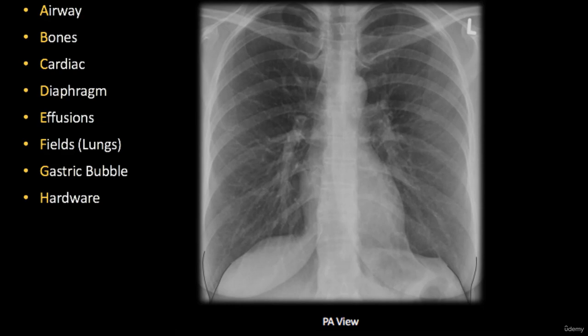Sometimes we can see a level of fluid in this costodiaphragmatic recess, and we call it effusion because we don't know what exactly this fluid is. We're going to make the next step then and take some fluid out, aspirate it, for biochemical examination to make the precise diagnosis and to figure out whether it is blood or pus or lymph or just interstitial fluid. So normally the angles are empty.